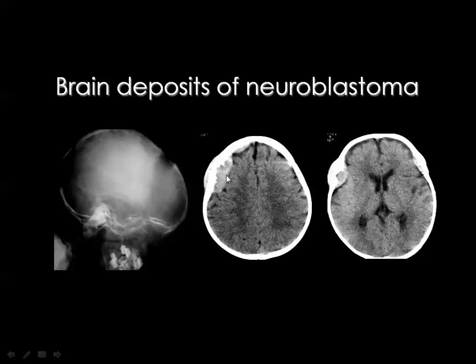And these lesions occur commonly near the orbital cavities, and they encroach significantly on the orbit, resulting in evident proptosis as well.